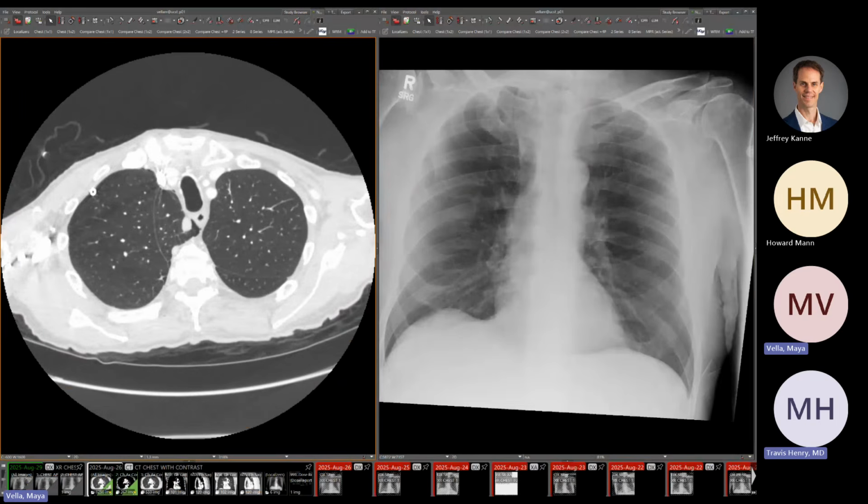Though, Jeff and I prospectively called a displaced azygos vein in a patient who was going to undergo right lobectomy for lung cancer. I saved it until I got the follow-up study and saw that it had popped out. Amazing. That's great. All right, those were my 2 quick cases.